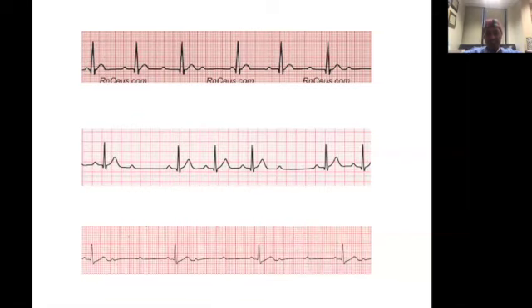Okay. Does everyone agree? You should get a hint from the way I'm asking the question. Okay, so you said third degree heart block. One of the criteria for third degree heart block is the atrium and the ventricle don't talk to each other. They do their own thing, right? So if this was a third degree heart block, why would we have a fixed PR interval? If you see all the QRSs, they are preceded by a P wave, right?